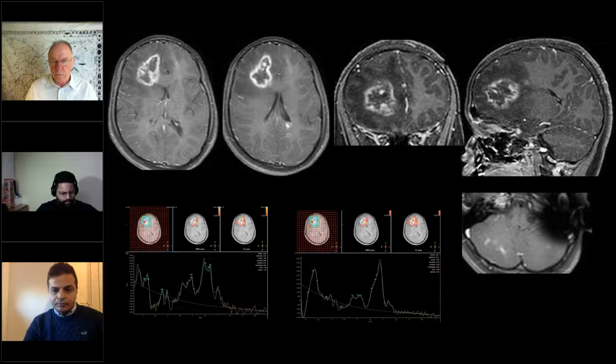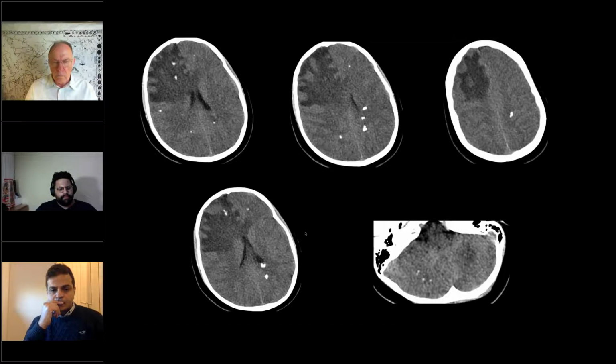Not for the calcifications. Even the cerebellar lesions are also showing enhancement, and there is a calcification even inside these lesions. Exactly, inside that big one also.